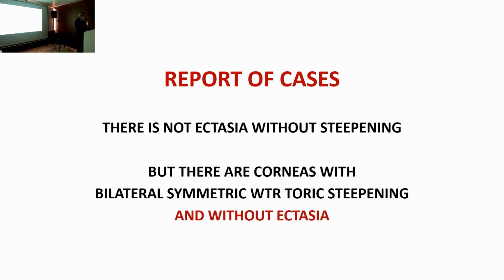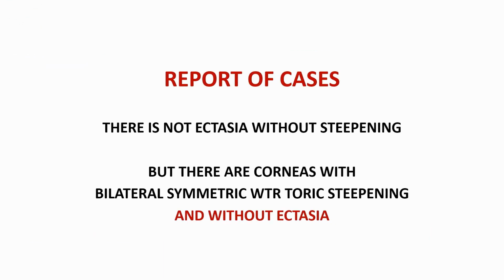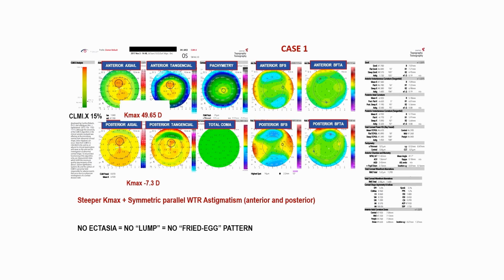Okay, so let's report cases after we saw this bilateral symmetric toric with-the-rule steepening. And this was my first case.